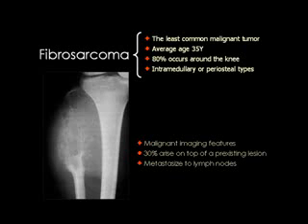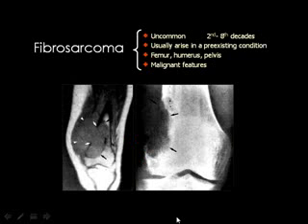We start with the fibrosarcoma, and this is the fibrosarcoma of the fibula. If you look at this plain X-ray, you can easily say that this is a malignant tumor because there is cortical destruction and the extraosseous soft tissue component. But you cannot say this is an osteosarcoma or Ewing sarcoma because of the epiphyseal closure. And this is an older patient, above the age of Ewing and osteosarcoma. Then you say this is a malignant tumor and go directly for biopsy to see what it is.